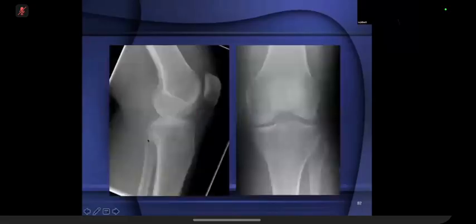The avulsion of the PCL can sometimes be seen on CT scan when you've got a bone fragment attached. So we go back to the plain X-ray, you can just about see it there. In the AP view, you can see a little radiolucent rim around the avulsed fragment, but then we can see it quite nicely on the CT scan where the avulsion has happened. We can see the outline of the PCL with an avulsed bone fragment.